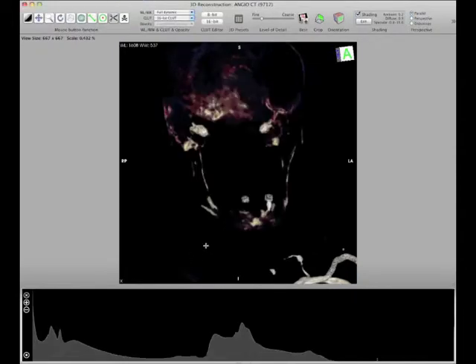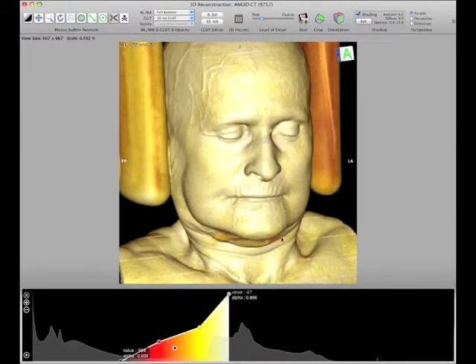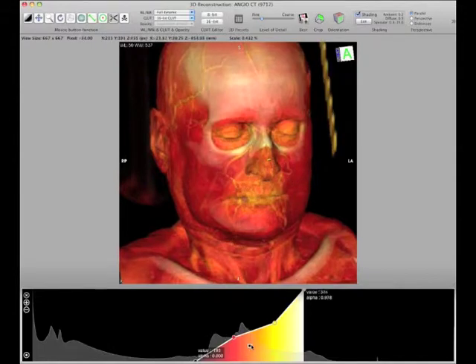And there we are. And we can add a new curve. And we're back where we started, right? So this in and of itself is very, very useful for you. I hope it will be anyhow. Our export functions are all over here. And we can adjust our shading in here as well. And I'll try to make some demos that show you that. But this should demonstrate for you the basics.